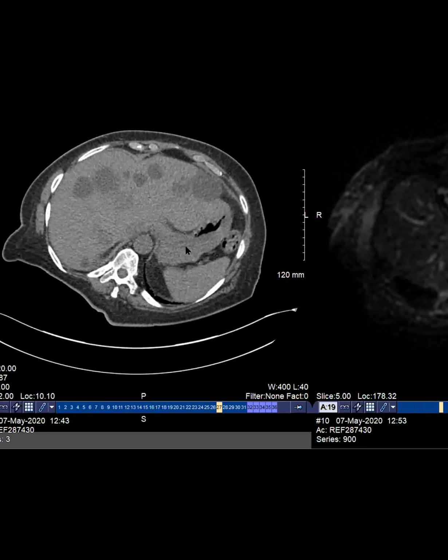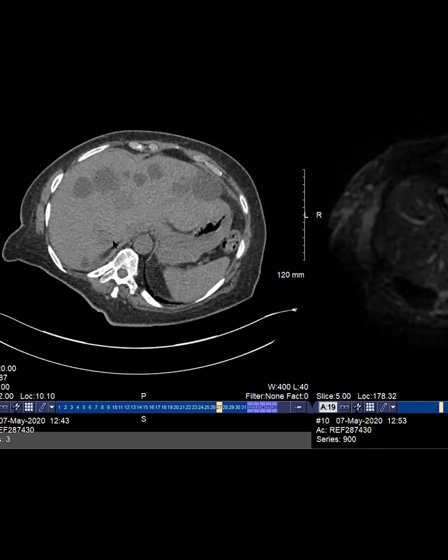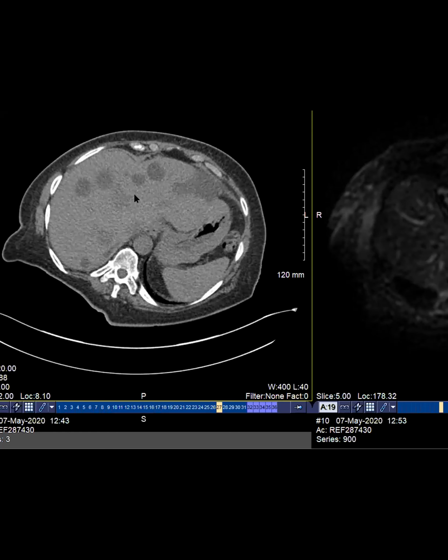So again, to reiterate the point that cholangiocarcinomas can be sneaky, and it was a good thing that this was biopsied, and it wasn't assumed automatically that this was a MET from the known malignancy, because the treatment pathways differ. So this is eye candy, and the take-home message is how to look at the liver carefully, especially when there are multiple cysts in a patient with an oncology history.